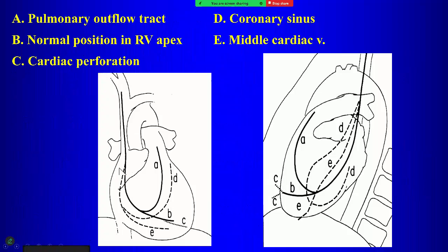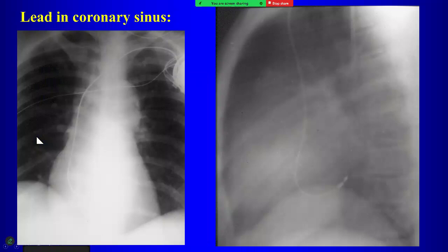So you're familiar with central lines and Swan-Ganz catheters and all of that, and where central lines go. Same principle applies when you're looking at lead placements to determine where the leads are going. After they place a pacemaker, they will get a chest radiograph. They will ask us to interpret the radiograph. So we want to look at the lead placement. We want to make sure it's where we expect it to be. We want to make sure the patient doesn't have a pneumothorax, right? So those are the things that you want to look at when you're looking at these leads.